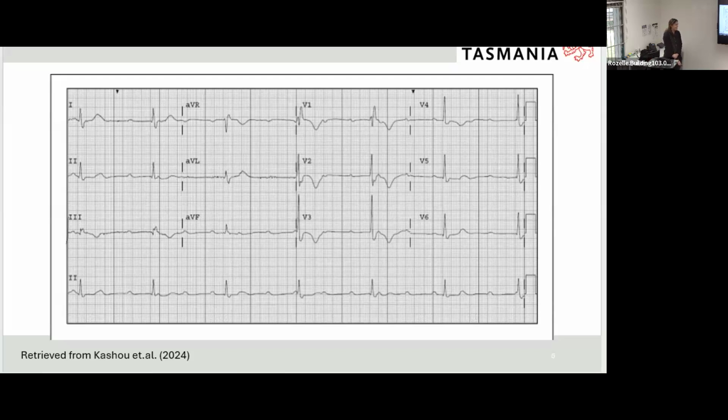So if we're calculating regularity, are we just looking at our QRS complexes, or are we going to be looking at our P wave regularity as well? Why is that important to know? Both, from Lucy? Yep. Both for heart blocks, fantastic. Mainly QRS, but P wave should be present. Absolutely, Jazz. Yes, because you might have a 3rd degree.